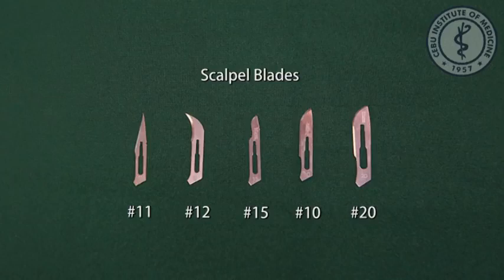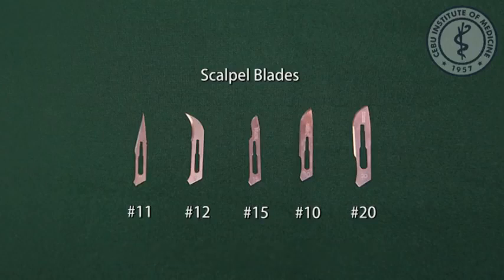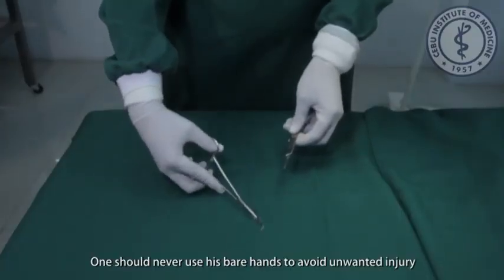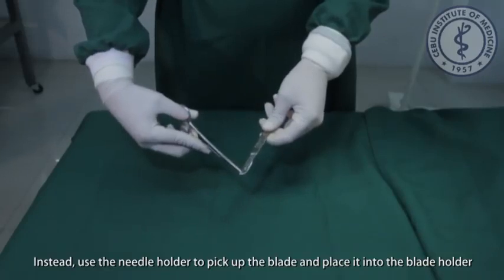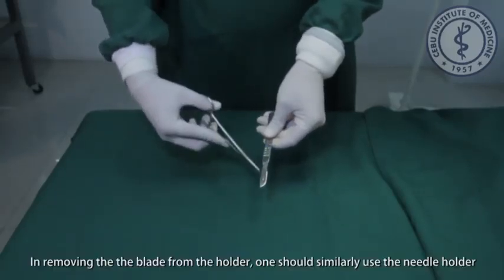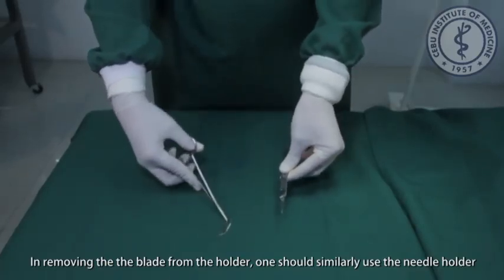Blade number 20, a large version of blade number 10 with a curved cutting edge and an unsharpened back edge, used for orthopedic and general surgical procedures. In placing the blade into the blade holder, one should never use his bare hands to avoid unwanted injury. Instead, use the needle holder to pick up the blade and place it into the blade holder. In removing the blade from the holder, one should similarly use the needle holder.